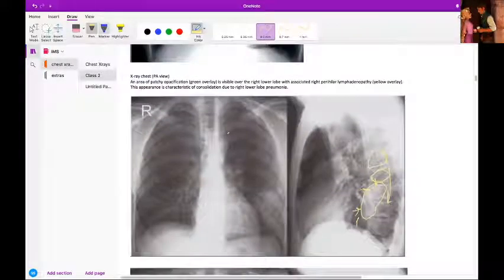Then we did this X-ray. In this X-ray, we see spine sign. So basically, what this spine sign means is, in this X-ray we can see in the PA view there is an opacification over here, and there is no silhouette sign. It does not touch any of the cardiac or the diaphragmatic silhouettes.